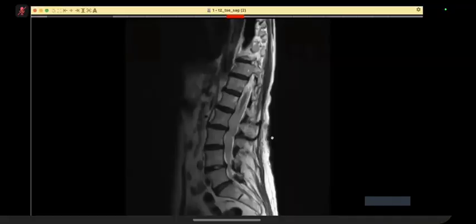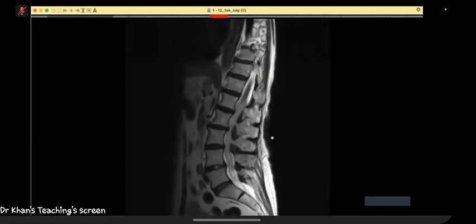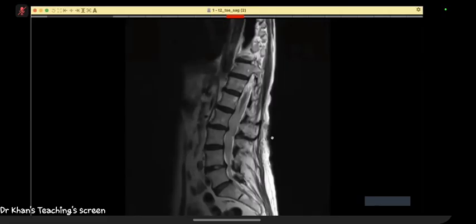I wonder if this soft tissue sheet could be part of leptomeningeal metastasis or CSF seeding.